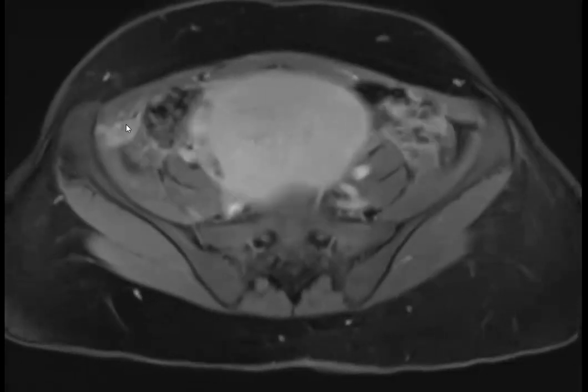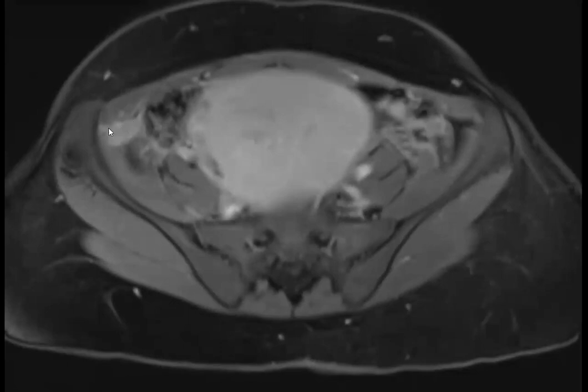One more thing that we talked about when we were showing this case in our group was: is it okay to have all this enhancement in endometriosis? I would say, especially when you have deep infiltrating endometriosis, it can incite a lot of fibrosis, and so it's often just fibrosis from that. It's not malignant transformation. We also often see that in scar endometriomas. So when it's that fibrotic reaction, that's usually just fibrosis.